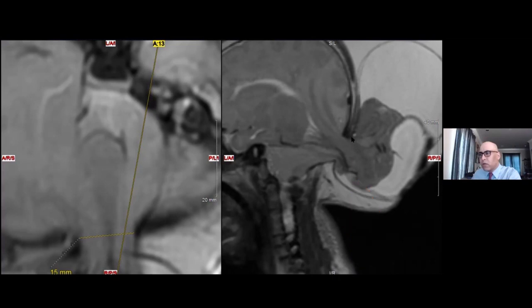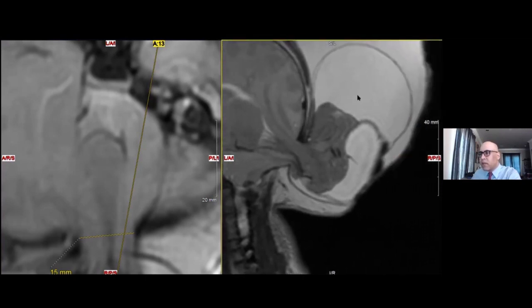Well, that's important because a neurosurgeon can't just say, well, this is an atretic brain, I'm going to transect it at the defect. They need to find out what is protruding into there. They also benefit from us being able to determine what membranes exist, whether some of these membranes need shunting, need marsupialization, or other treatment. So this is an occipital encephalocele resulting in, among other things, features of a Chiari type 3 phenotype.